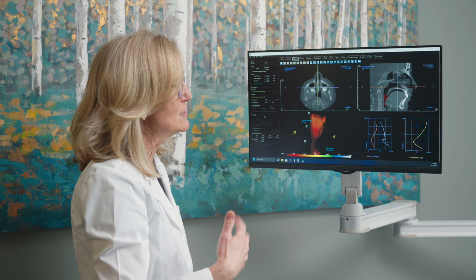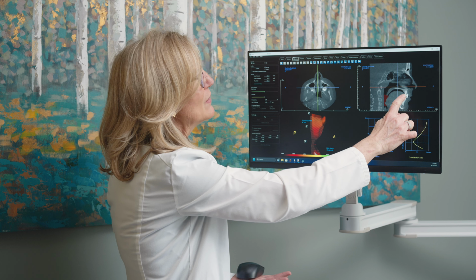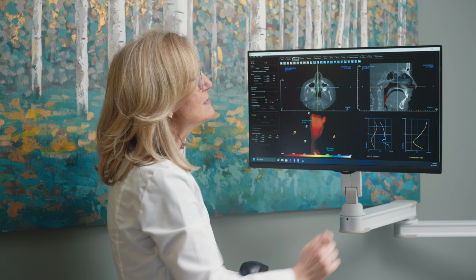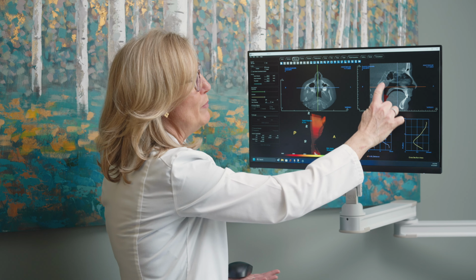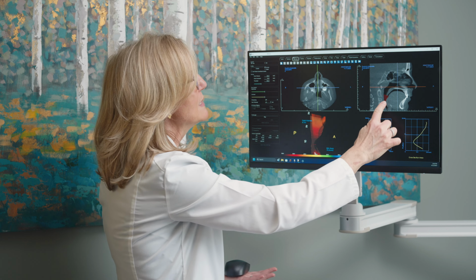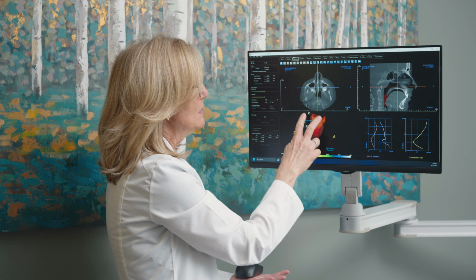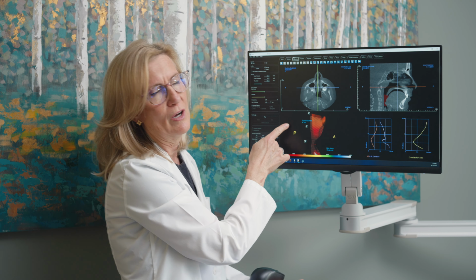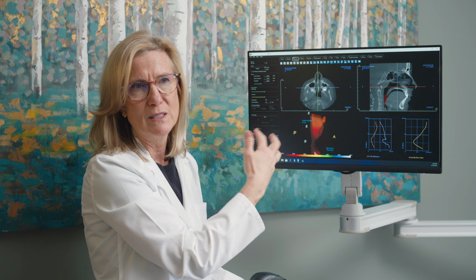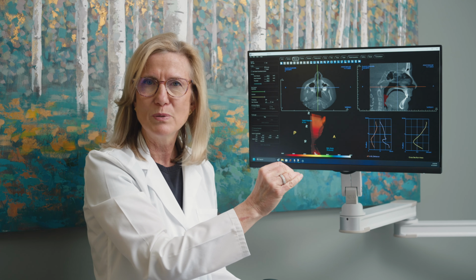So here's another patient. This is actually a child, and what you can see is her tongue is not on the roof of her mouth. Can you see the space there, the air that's between the palate and the tongue? And look at the difference in airway size between this patient whose tongue is not up. Can you see how it's red? So her total volume is 4.1, mine is 19 point something. So that's the difference in tongue position.